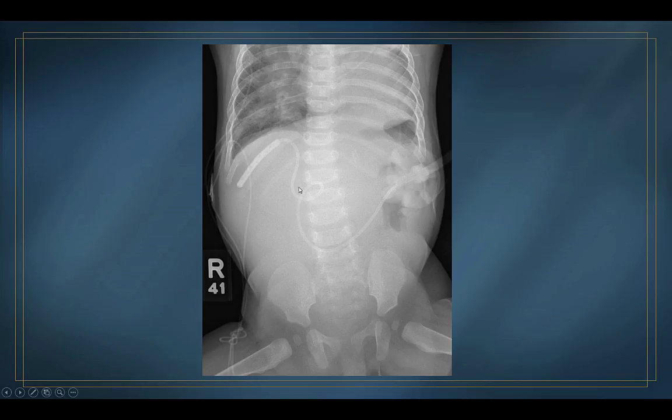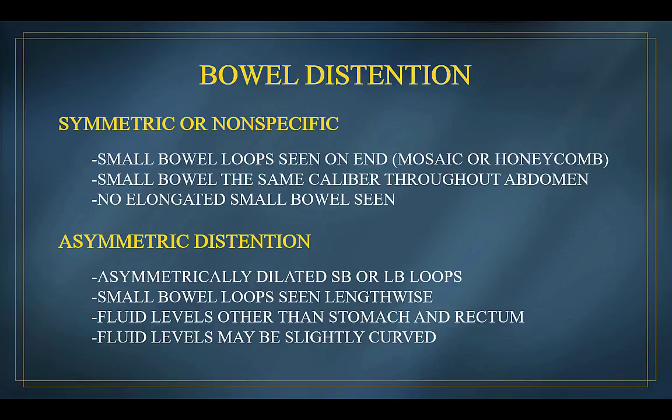I don't know where exactly the pylorus is, whether it's here or here, but when the liver is not sitting in its normal position in the right upper quadrant, which it often isn't in an omphalocele patient, the retroperitoneal structures will move. The liver, the right kidney will move higher, and even the duodenum, even though it's a retroperitoneal structure, will also migrate. So you don't need to get hysterical about where the heck this tube is going. Why is it completely out of the confines of the normal position of the C loop? Okay.